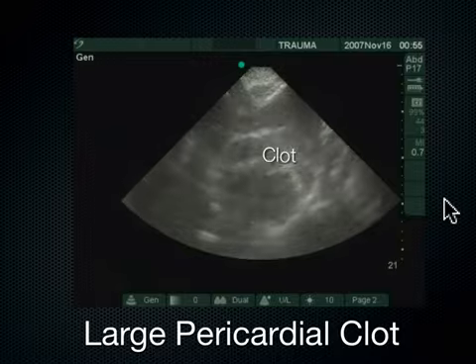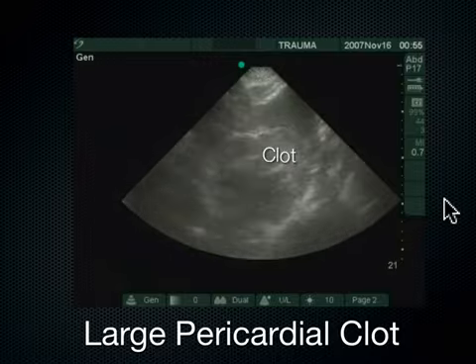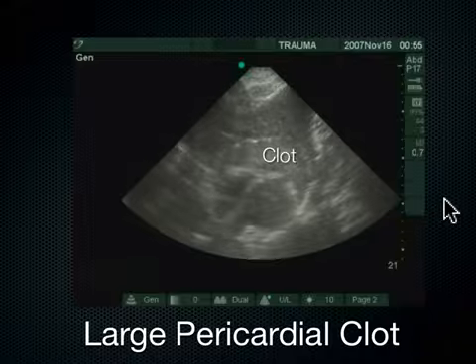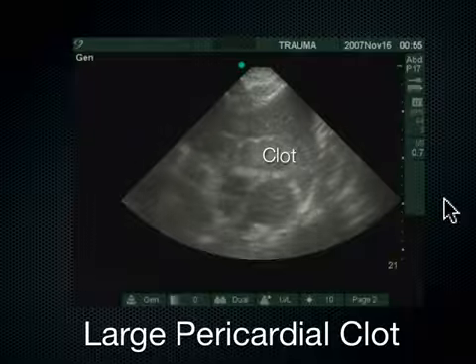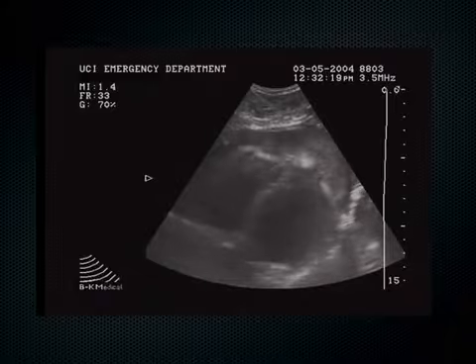Do you stick a guide wire down there and just start, I don't know, mush it up a little bit? Turn up the power on the ultrasound? Yeah. Yeah, I like that. That's good. Pulverize it. Just start doing precordial thumps. I don't know the answer, but how about this one?